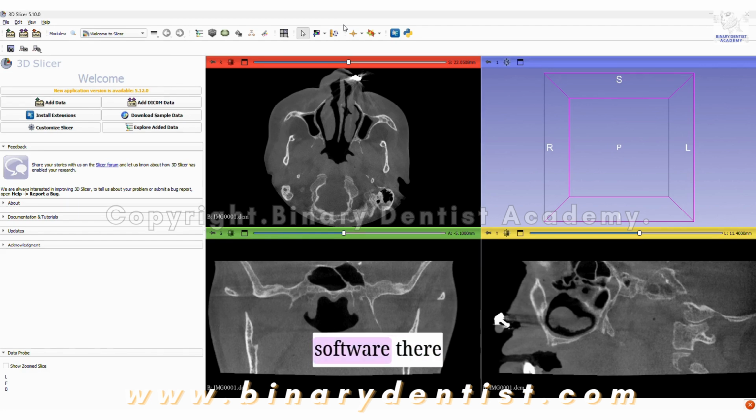In 3D Slicer software, there are generally 2 methods of converting a CT scan to a bone model. One is an easy method, which helps us to screen the CT scan initially to check whether the margins have been covered at the desired location or not. The second is a slightly difficult, time-taking method, but it is more helpful in defining thinner bones like pterygoid bones.